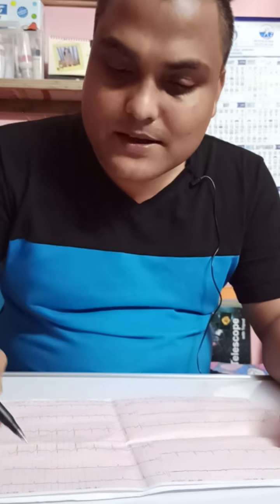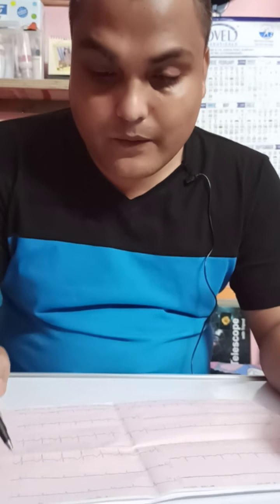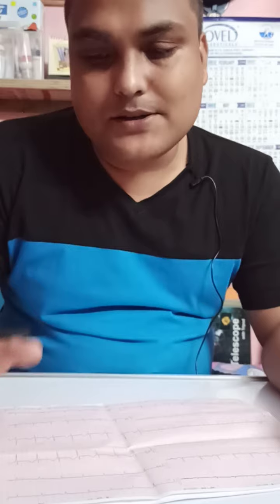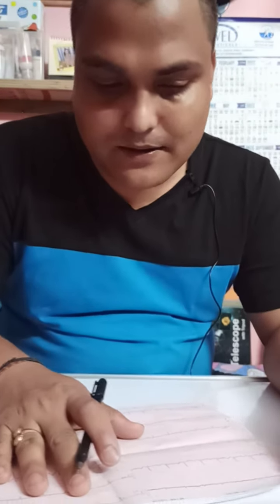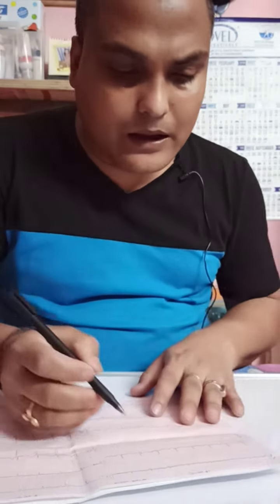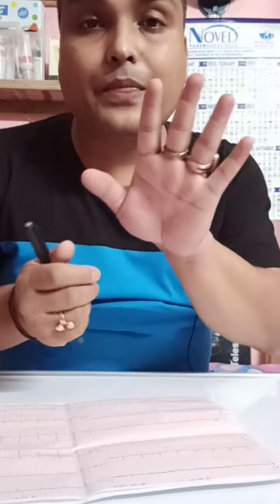That means you have mentioned 12 lead and resting state. Holter monitoring is another one; that would be so long, about a bundle of papers. Here, in a resting stage, the subject is not on a treadmill. We are in resting state, and ECG is taken. Here you see lead 1, lead 2, lead 3, at least 3 waves. There is a rule that you have to take 3 QRS complexes in each lead.